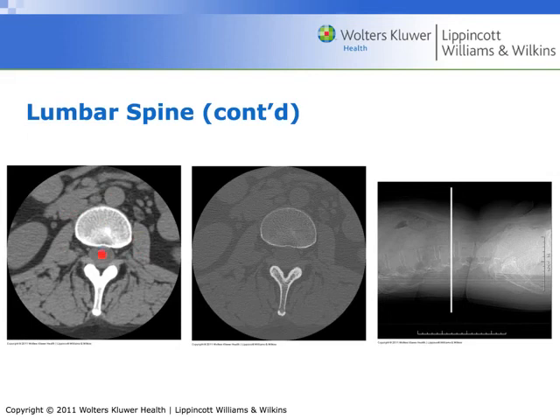Within this area here, we see the dural sac. I cannot visualize it on this image, but just a second here. Yeah, here we go, sorry. L2 lamina and the L2 spinous process.